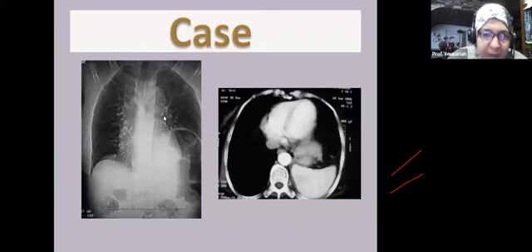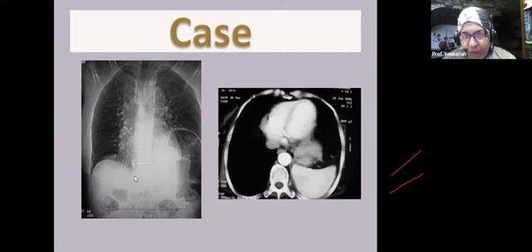This is another case, a scanogram. You see the mediastinum is central. There is no shift of the mediastinum. There is elevation of the left cupula. And when you look at the axial image, you will find there is a lesion. There is viscera posteriorly, okay? This is the spleen, and this is the fat within. And this posterior lesion abutting the chest wall here is again a Bochdalek hernia.